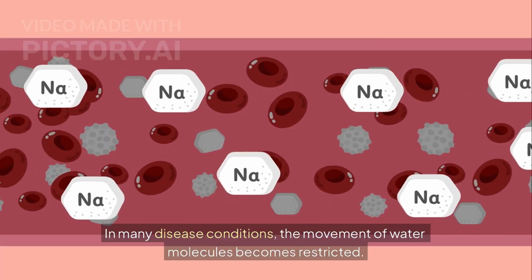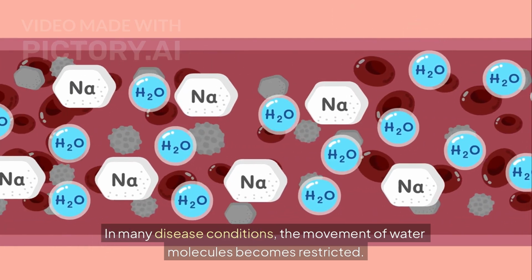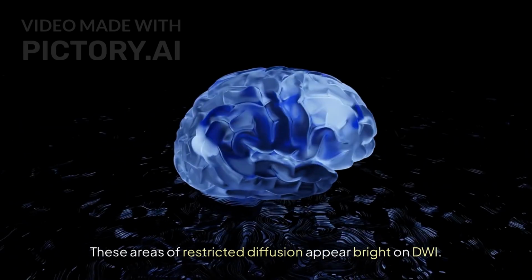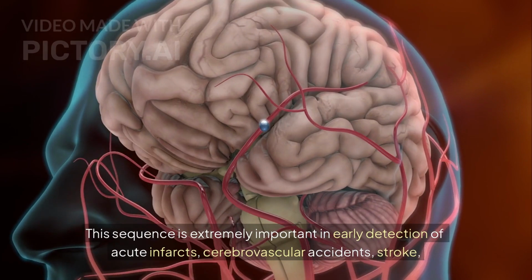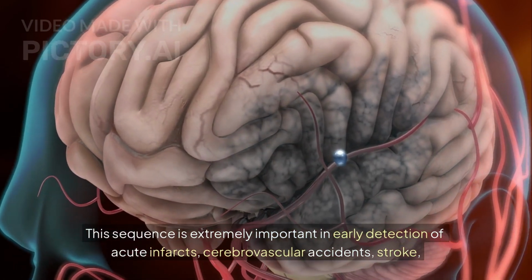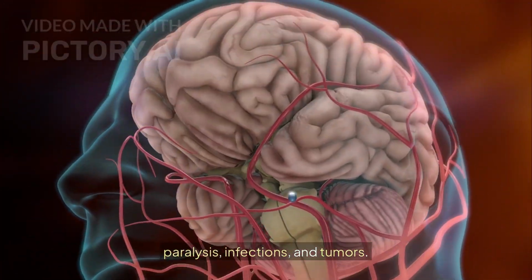Diffusion-Weighted Imaging, or DWI, is used to assess the random motion of water molecules within tissues. In many disease conditions, the movement of water molecules becomes restricted. These areas of restricted diffusion appear bright on DWI. This sequence is extremely important in early detection of acute infarcts, cerebrovascular accidents, stroke, paralysis, infections, and tumors.